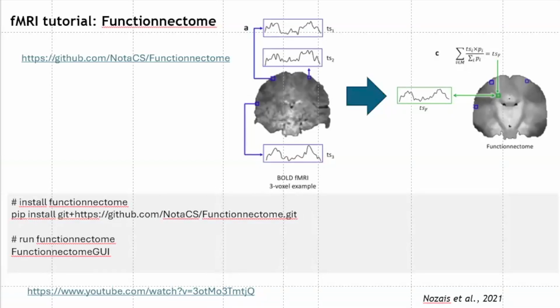So we finished with the first level analysis. What we want to do now is functional connectivity. Michelle explained already what we are doing. We have the time series from the first level analysis, with different time series for different voxels, and we want to project this signal into the white matter.